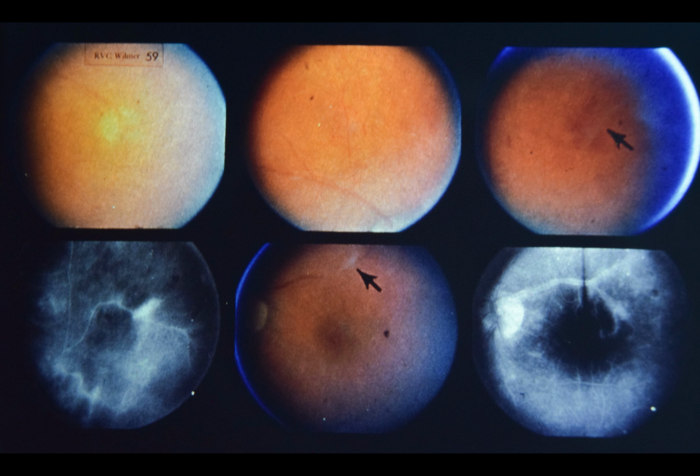At this visit, large KP were present in the left eye, and white membranes were seen over the inferior pars plana, both eyes. Lower left, note dye leakage into retina, staining of vascular endothelium, and widespread capillary non-perfusion. Lower center, note vascular narrowing and perivenous sheathing in left macula. A fluorescein study of this area, lower right, shows staining of the vessel walls and dye leakage into the retina.